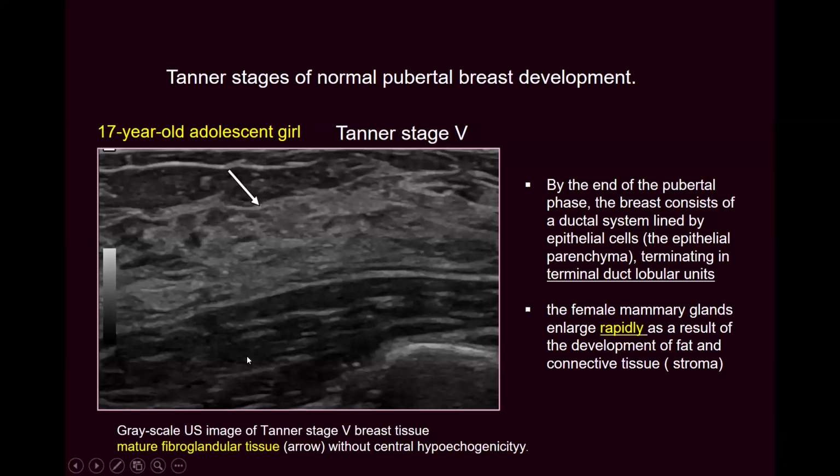The stroma appears hyperechoic. We said the intralobular stroma is loose and appears gray, which is why it is isoechoic to the fat. But the interlobular stroma is compact and extremely white. That represents the whitish appearance of the fibroglandular component. That is why it usually looks more hyperechoic, with small lobules scattered within the hyperechogenicity.